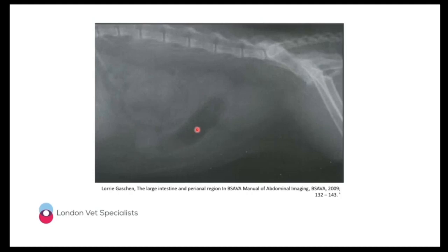If this is indeed a dilated loop of small bowel, as we suspect, then that's dilated enough to warrant an exploratory laparotomy in this patient to investigate a possible obstruction and mechanical ileus.